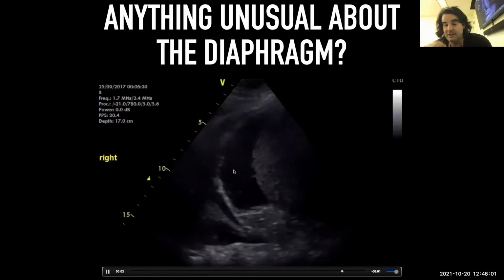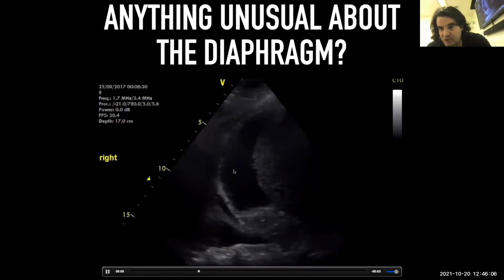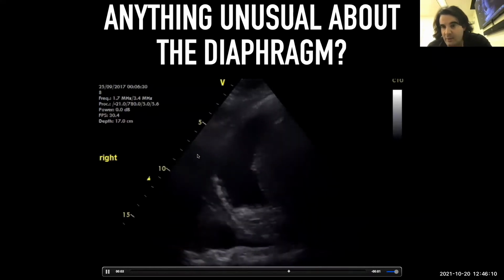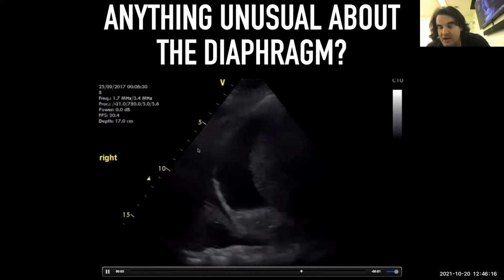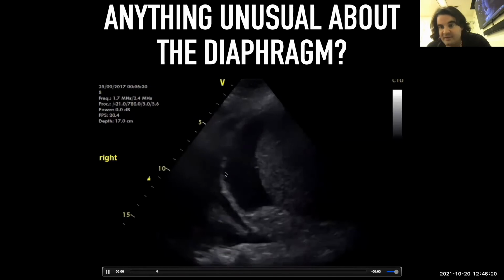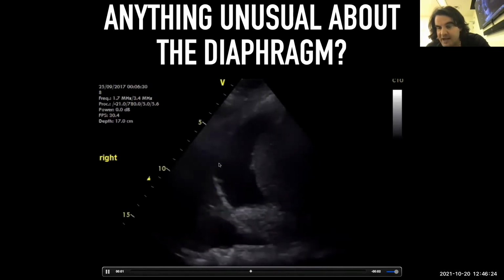It's being pulled because the actual intrathoracic pressure upon inspiration will drop, of course. And so it actually pulls the diaphragm upwards, creating what we call a paradoxical movement in the diaphragm. So if you're doing fluoroscopy, this is what you would see: the diaphragm moves upwards upon inspiration instead of excursion, which is downwards. So this, in fact, is a paralyzed hemidiaphragm, and it's been displaced very apically.